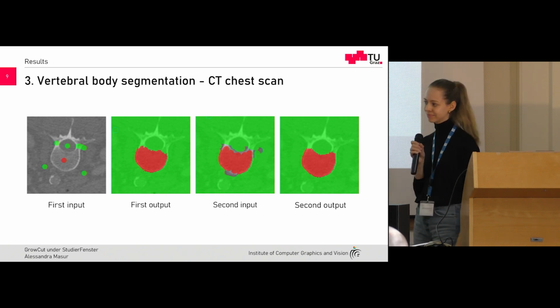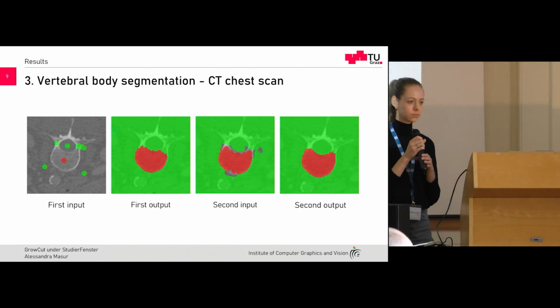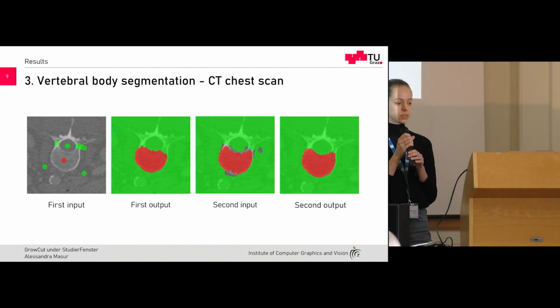It does. We would need to adapt the medical 3D viewer and the input mask a bit. The algorithm already allows it. And I did some experimentation on the website. You could even select something like a donut. If you make a red dot, then a green circle, then red around it again, then it already notices this multi-label segmentation. But yeah, we would need to add some more colors to make a proper multi-label segmentation.